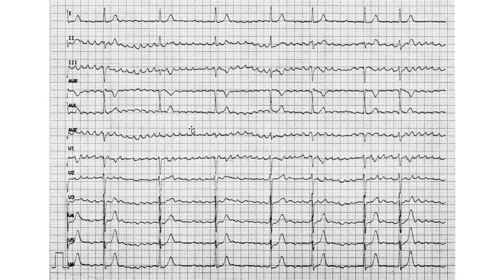This is question 23, by the way. So at least based on the question, they've answered it based on the fact that the FF peak is 4. Because it is 4 over here, we can clearly see it. So 1500 divided by 4 is 375. So it's maybe fibrillo flutter.